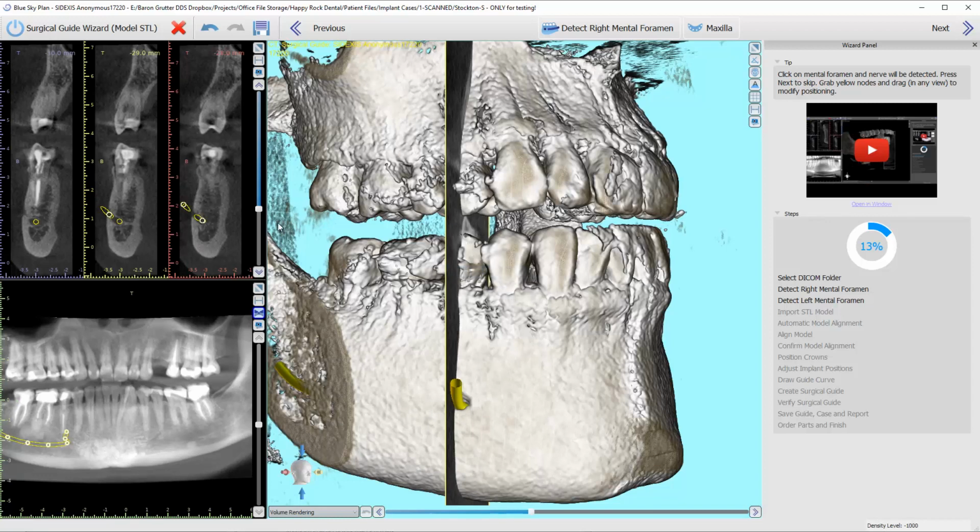And now I'm going to review it because I want to make sure that it did it properly. If it doesn't do it properly, just click up here. Do you want to remove it? Yes, I want to remove it, and I'm going to do it again. Okay, so if it does a funky one, like really crazy, try it again. If it still is terrible, well, then you're going to want to come here and manually fix it.